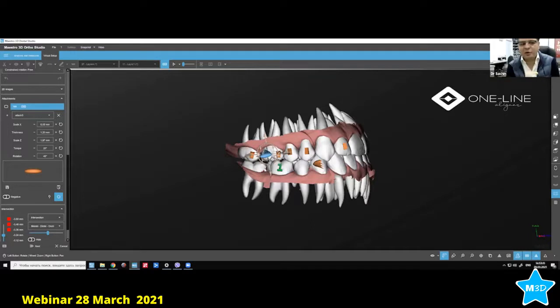And I was not sure if it was going to print well, but when I printed, it came out pretty good. And when we did the aligners also, it's a perfect hook. So you don't have to put any more buttons for class 2, class 3 elastics. Yes, in the upcoming version 6 of Dental Studio, there's also a possibility to position two aligner folds together.